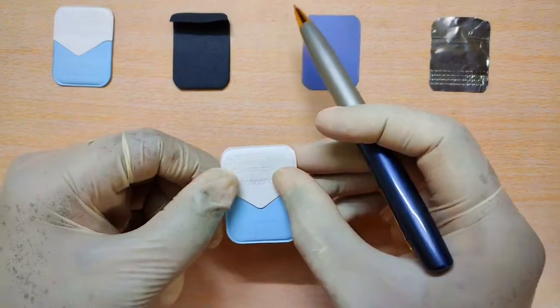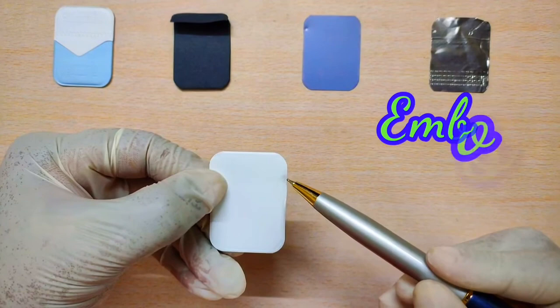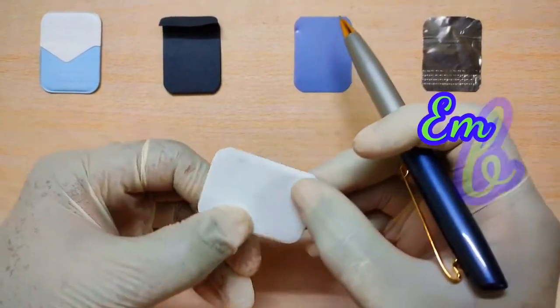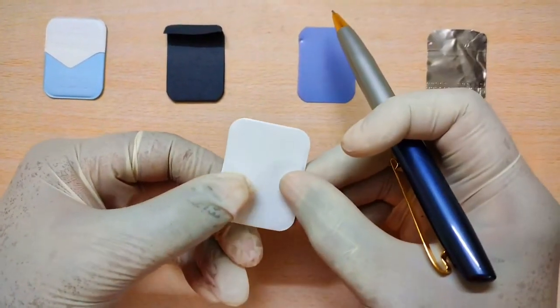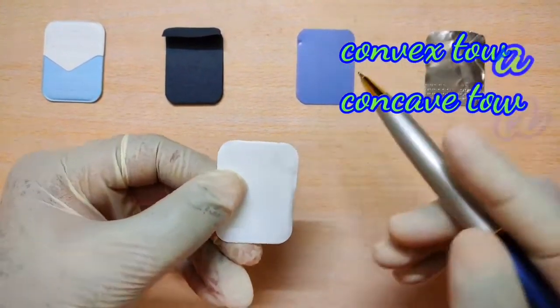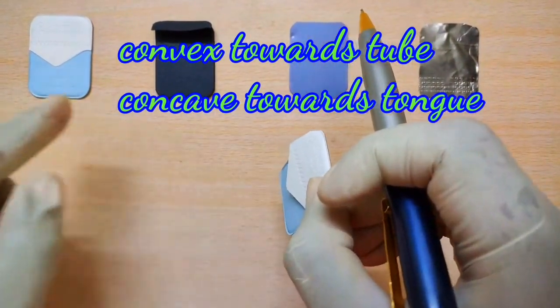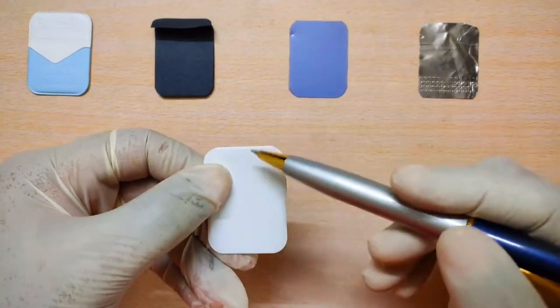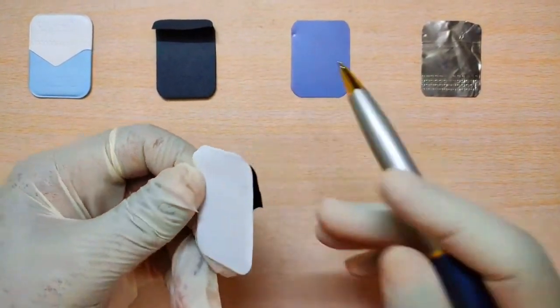On the tube side in the corner of the outer plastic wrapper, it has a small raised dot called the embossing dot. This is used for film orientation, like to find out which quadrant or anatomical location the particular radiograph belongs to, either right or left, based on the features of the teeth and the anatomical landmarks which are seen on the radiograph. The convex surface of this dot should always face the X-ray tube and the concave surface towards the patient's tongue. The outer plastic wrapping is a waterproof material and hence protects the film from moisture and saliva. It is seen on both sides of the film.